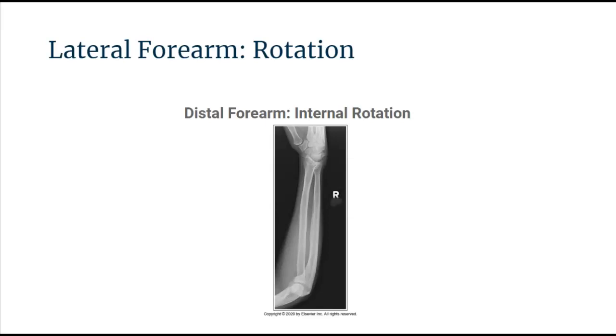Typically, external rotation does not occur as much unless there is some mispositioning caused by the forearm and humerus not being placed in the same horizontal plane. The body's natural sitting or natural position would be to internally rotate rather than externally rotate the arm.